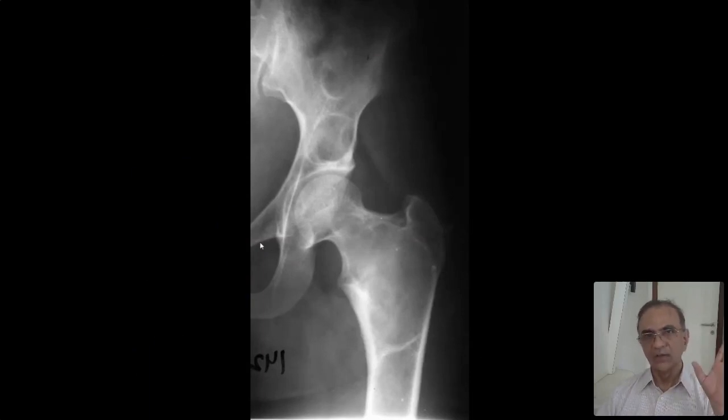First of all, appreciate non-tubulation. Ignore the obvious. You see lesions in the femur. There are lesions in the ilium, in the supraacetabular region, and the one above that. So when you see multifocal disease like this, it is part of Albright syndrome. It's not just local fibrous dysplasia, there are a whole lot of clinical implications. If you feel like it, you can read about this, but read Bumpy Bones.